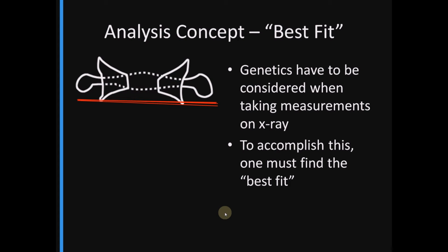If they all were on the same plane approximately, then we would have, in this example, 3 out of the 4 lines in complete plane reference agreement. 1 is a slight bit off, which happens to be the inferior masses. So that would tell us that the inferior tips of the atlas are not symmetrical with the rest of the bone structure, and therefore the inferior tips of the atlas would not be a good reference to choose as the most consistent line of reference for this atlas bone. And in this example, we would have selected the inferior aspect of the posterior arch attaching to the lateral aspect of the lateral mass as our most consistent point of reference on this patient's atlas.